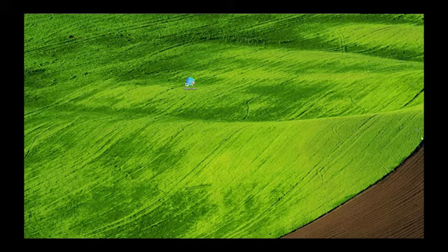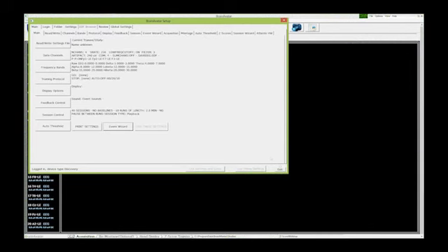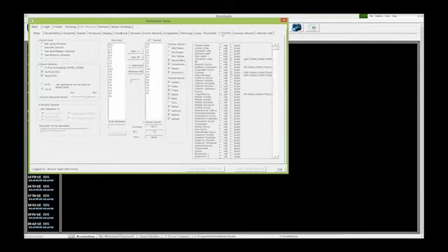Amplitude is not checked in the last protocol. What Z-scores are the sLORETA training? All right, let me try and break that down. The last protocol that I had open there, Lauren? I'm in the combined protocol right now. Are you talking about this Brodmann if this isn't checked? Oh, you're talking about this absolute power, if that's not checked? Aha, okay.